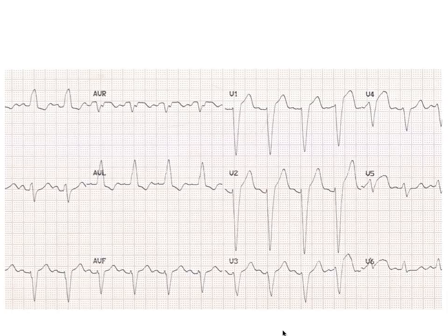And you can tell that this is a left bundle branch by, if you look at the QRS complexes, they're wide. They're wide down here in the precordial leads, and you notice there's no R wave progression at all. You can also tell that the conduction pathway is not left to right as it should be. It's actually right, and it's going around the fascicular branches and then into the left side. So it's kind of going backwards. So that's a left bundle branch block, and I have more info on that in the other videos. So this is a MI equivalent, and you need to call the cath lab for this as well.